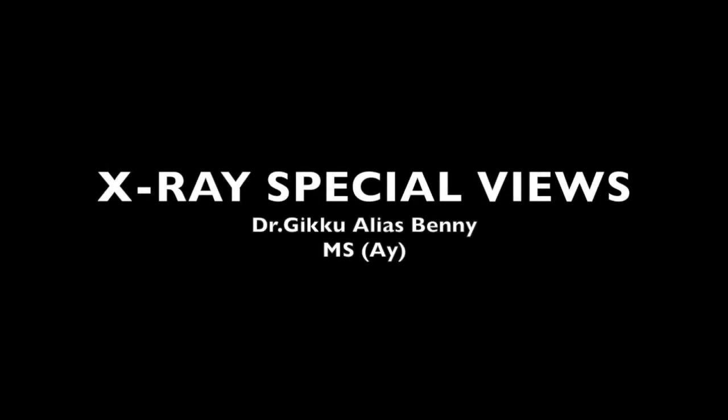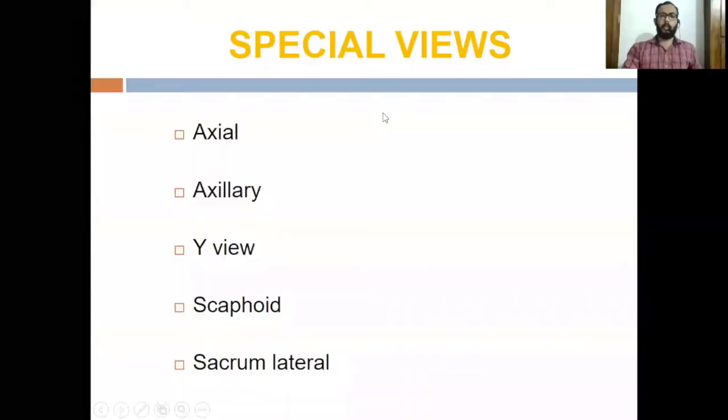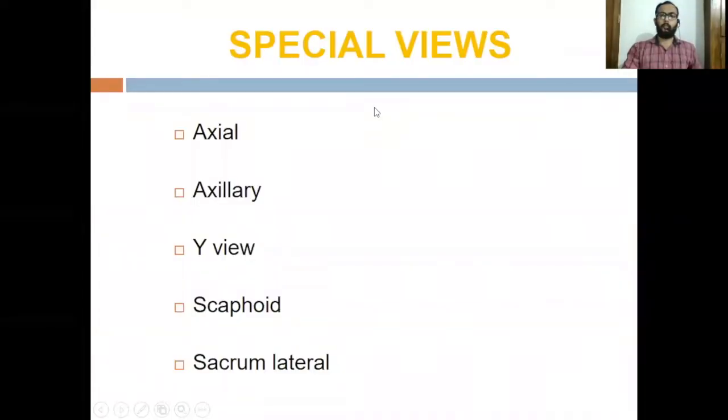Hi friends, in this video I would like to discuss some special views of X-ray. The special views include the axial view, which is very useful in the diagnosis of calcaneal fracture. Calcaneal fracture is also known as lover's fracture or thieves fracture.